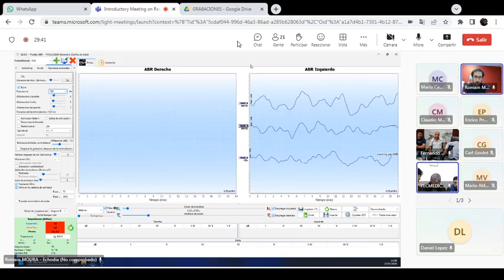There is a point which mentions data about the osseous vibrator. The equipment has the option, but it is not enabled because we need a license in order to use it. So there is a problem with the license, right?